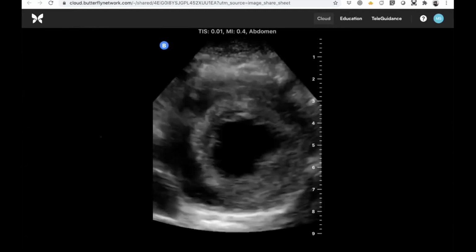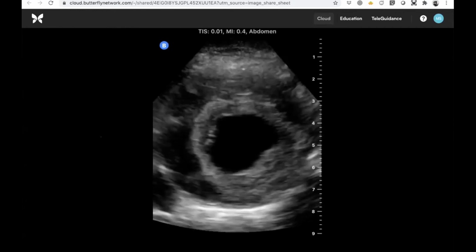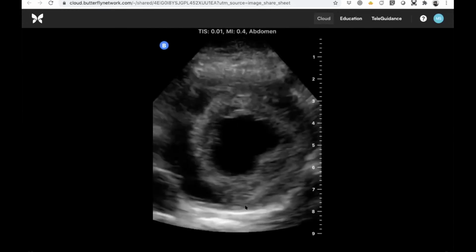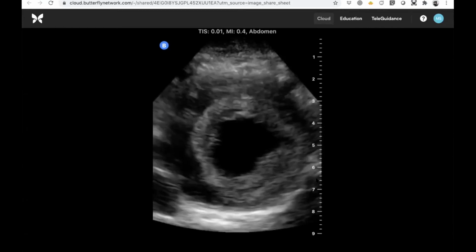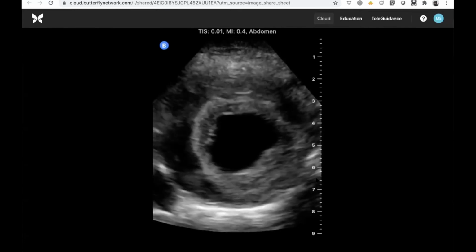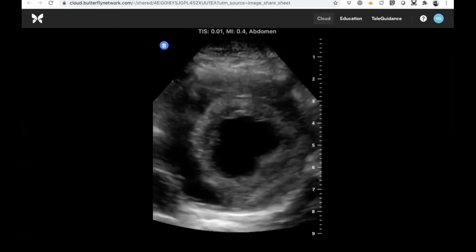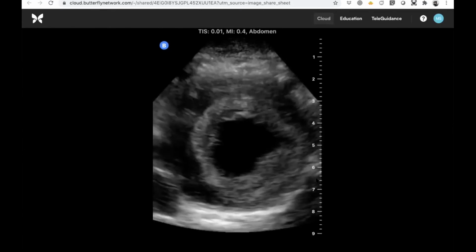I mean, they say abdomen, so I'm going to have to guess. And where are they? If they're central, then it probably is going to be aorta, or if they've zoomed into the right upper quadrant, then this could be a messy looking circular structure which might be gallbladder with a whole lot of fluid around it. So I don't think it's that. But yeah, I'm going with aorta. Yeah, I'm going with aorta, and this one's from Brian, who's an internal medicine resident in Colorado.